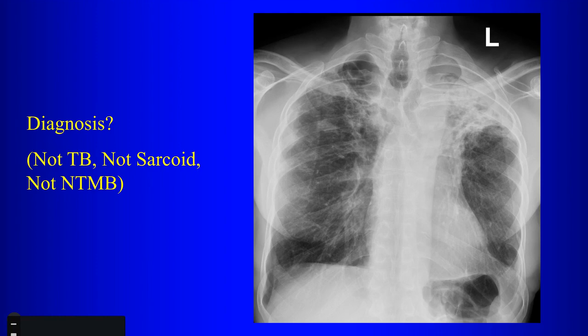Well, looks like maybe fibrotic or scarring. Where? On the lobe. How do you know it's scarring? I didn't know this is not a tumor. Well, what tells you it's scarring? Oh, the loss of volume. Yeah, there's architectural distortion, right? So the lung is smaller on this side, the hilum is elevated here, right? So there's some volume loss, also some apical pleural thickening. So there's scarring here. Also on the right side, you have reticular opacities, kind of fibrobullous changes, some nodular opacities.